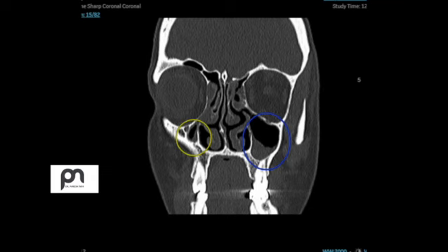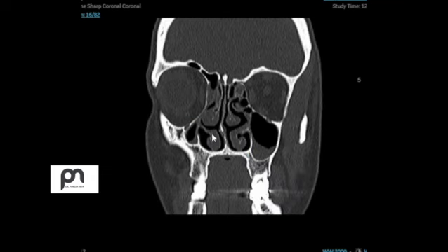You can also notice this ledge of the inferior turbinate. It is way far from the body of the inferior turbinate. This ledge is almost always present in this finding. The medial wall of the maxillary sinus is pushed laterally.